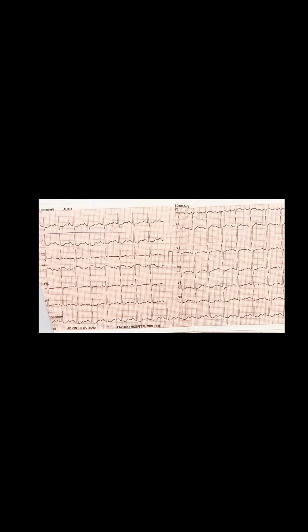So this young patient, a 27-year-old male, comes to me with a complaint of palpitations, more so on exertion, and hands me over his ECG, which was showing sinus tachycardia, somewhat prominent Q wave in lead 3 here, and somewhat prominent R wave in lead V2. I asked the nurse to get his vitals.